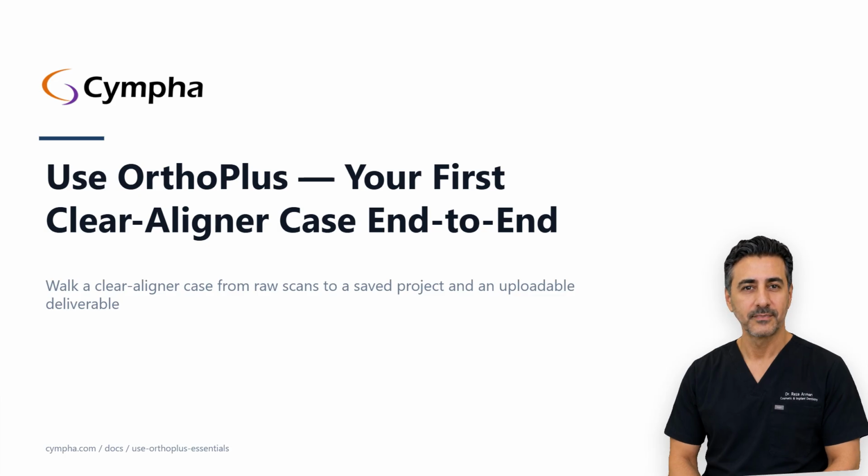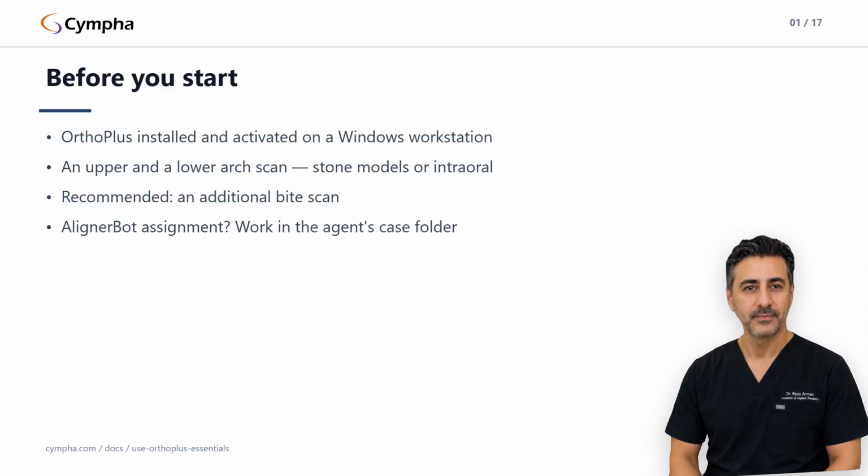Let's begin. What you need on the bench. orthoplus installed and activated on a Windows workstation. The Setup AlignerBot guide covers the subscription, the activation code, 10 minutes, one machine, and the installer. This lecture assumes the main window is already open.